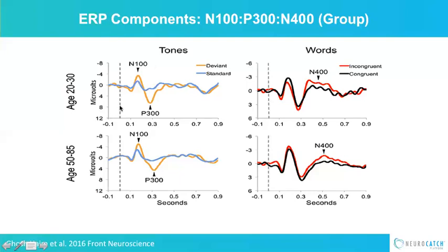Now let's walk through this healthy adult sample. This is an average of a group. So you're getting kind of a composite look at what it looks like. And there's a couple things that you need to train your eye for. So the first thing is, if we go to our 0 point and we go back, this is recording before the stimulus. We call this the pre-stimulus baseline.